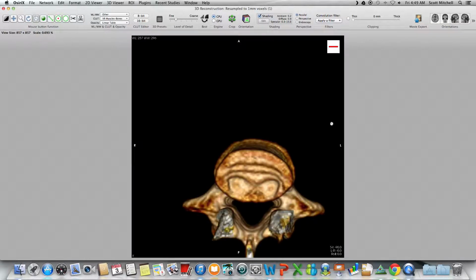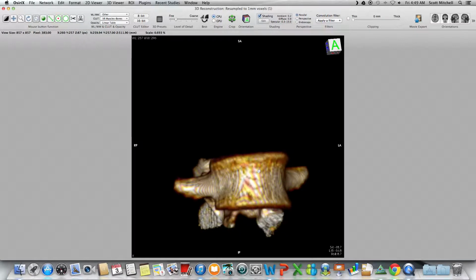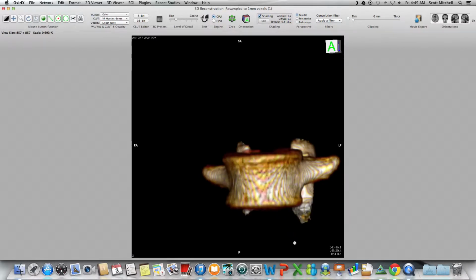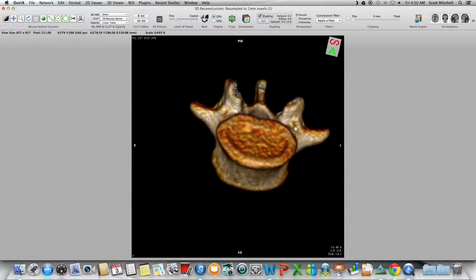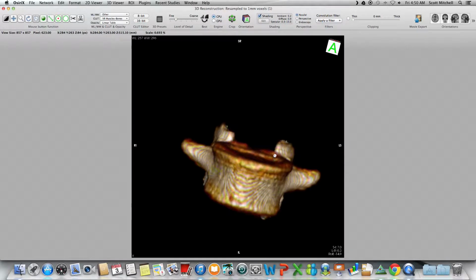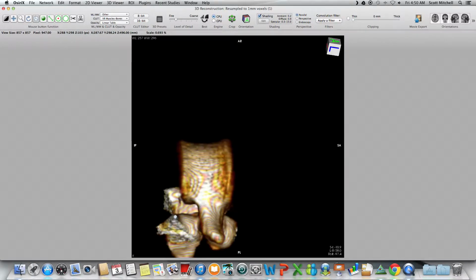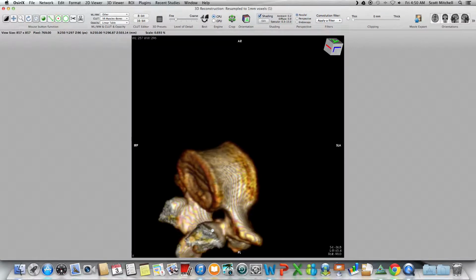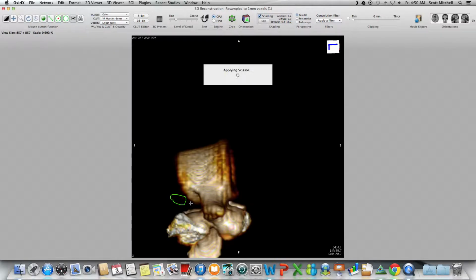Here, let's just take a few looks. Make sure we're not missing something that's glaring at us. So I think the top looks alright. It's okay. It's not perfect, but we'll clean up afterwards. There's a little bit right here that I'm trying to get. It's hard to see where it begins and ends. Let's see if I got it.